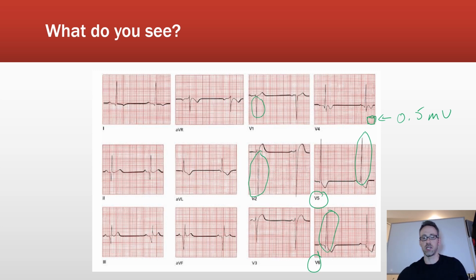So this here, again, suggests left ventricular hypertrophy, definitely by that criteria. In fact, if we look at lead 1 from our other criteria, that's about 15, so that meets that criteria. And it looks like not quite 11 in AVL over here, so it doesn't meet that criteria. So it meets at least 2 of the criteria we talked about.